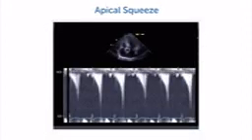If we put a continuous wave Doppler through this flow acceleration, we see the typical pattern of a late systolic peaking flow acceleration. Now the velocity is usually not very high and it's not hemodynamically significant, so there's no real obstruction because it occurs very late in systole.